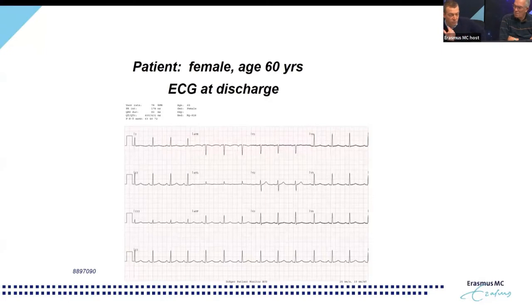In cases of real spontaneous hematomas, the likelihood that they will progress and end in a full luminal compromise is lower compared to hematomas that are subject to large inflow dissections, which might continuously fill the hematoma and thereby blow up the vessel even more, and have a higher likelihood to deteriorate, as shown in this case. As a matter of fact, we saw those dissections that you described, and then we checked after 3 or 4 weeks with an angiogram, and it was completely recovered and the patient was happy.